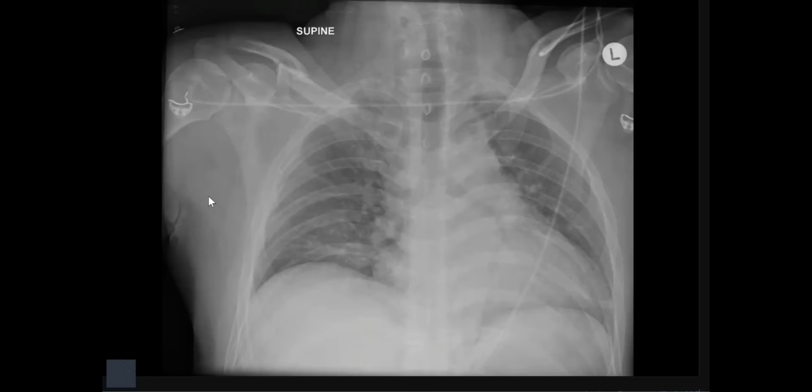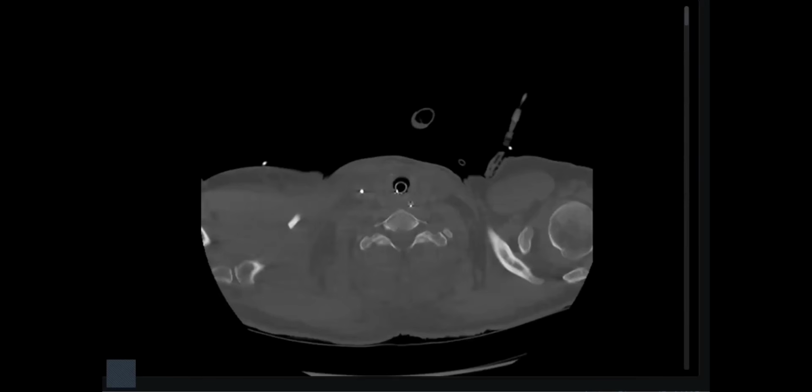Whenever you suspect rib fractures, it's advisable to perform a CT scan. It's very important. No mediastinal widening here, just subtle, maybe positional, and no pneumothorax, intact hemidiaphragm to rule out any diaphragmatic hernia. And of course, the patient is supine, with multiple ECG lines. I'll give you now this one.